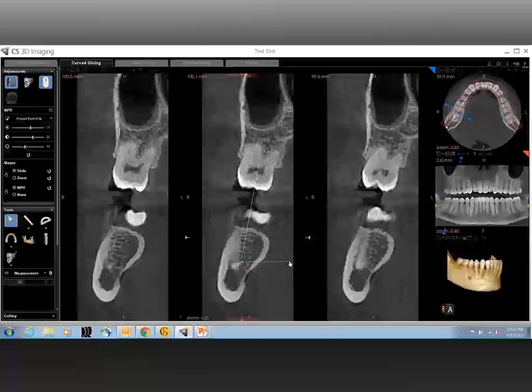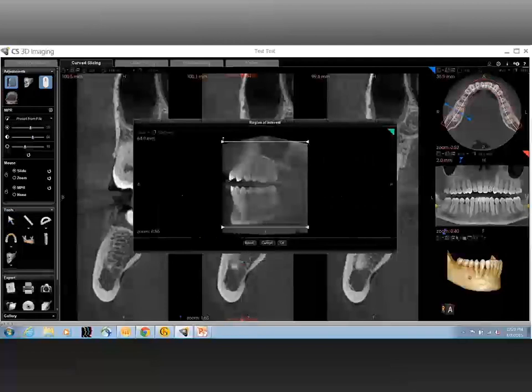Now, how does it help you in terms of implant evaluation? In cases where loading of the implant becomes critical, especially in the posterior area, it is good to identify that angulation of the ridge to change any kind of angulation that is needed in the surgical procedure. Now, once the angulation of the ridge has been analyzed, and I again emphasize it does not necessarily have to be in this order, you have to critically also view the morphology of the ridge.